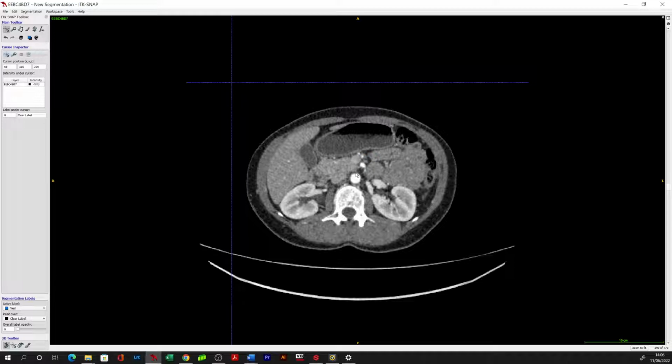So sometimes when the imaging is difficult, you can combine some experience, but also your underlying understanding of anatomy, which can really help you differentiate what these things are if you're struggling. You know that the typical configuration is that the MCA and the MCV will run along with each other, as the arterial and venous vessels are often paired.